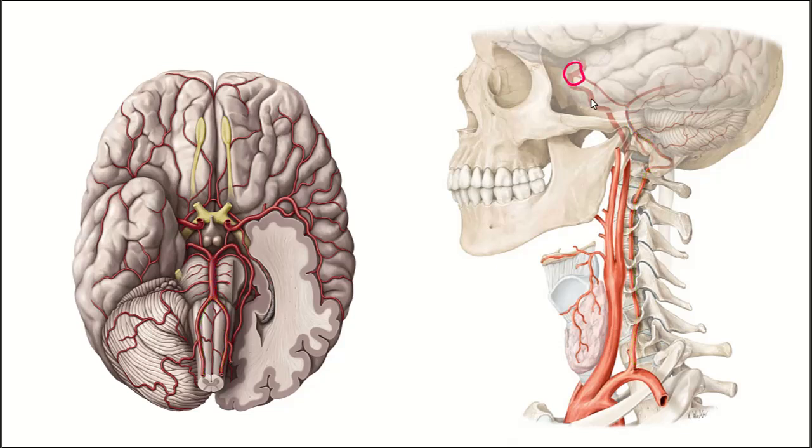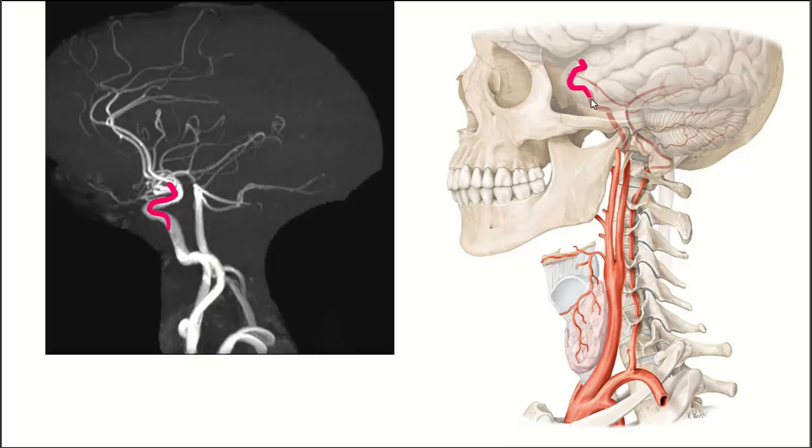So now looking at the internal carotid artery and the basilar, this is where we see the internal carotid artery. We can see this lateral view matching the position of the diagram and the basilar here. So you can see that they are separate from each other. This MRA image shows the vessels all together. And this is early on, when the contrast has just arrived. We see it's just arrived going up the basilar, and it is also now in this posterior cerebral artery as it goes to the back side of the head. Here we're going to the middle cerebral, as well as the anterior cerebral, which goes forward and whooshes up and over.